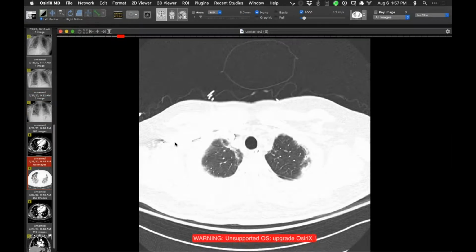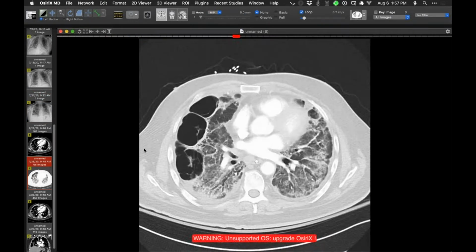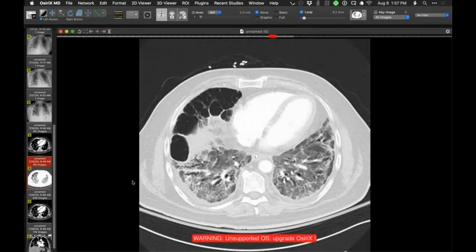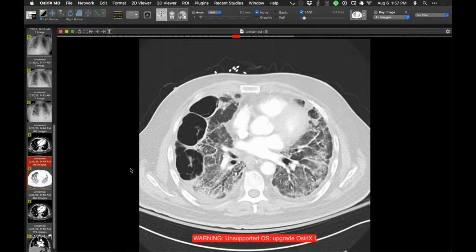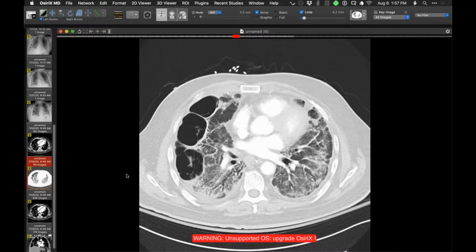I was really surprised to see this. Look how large and the distribution of them in that person 2 weeks later. So we have other findings, of course, we just call that organizing diffuse alveolar damage. But this is the first time I've seen cystic spaces like that. Has anyone else seen that? The lung is just disappearing in there.